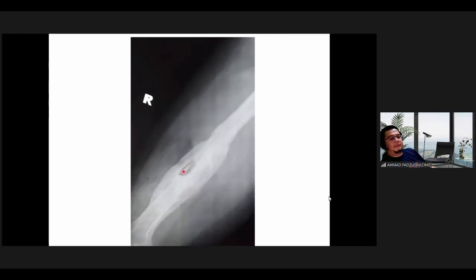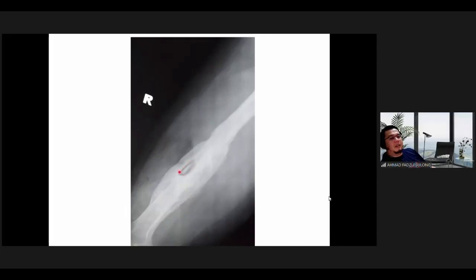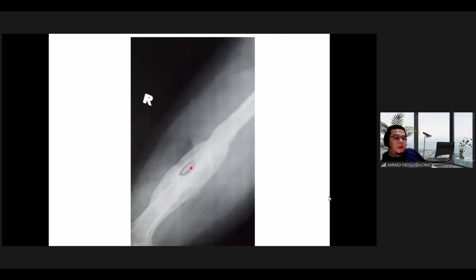This black part. Discharge. What is the content in here? Is there anything within here? Pus. Okay, usually it's pus. It's an empty space, okay, because your healthy bone will never be able to incorporate or resorb your dead bone.